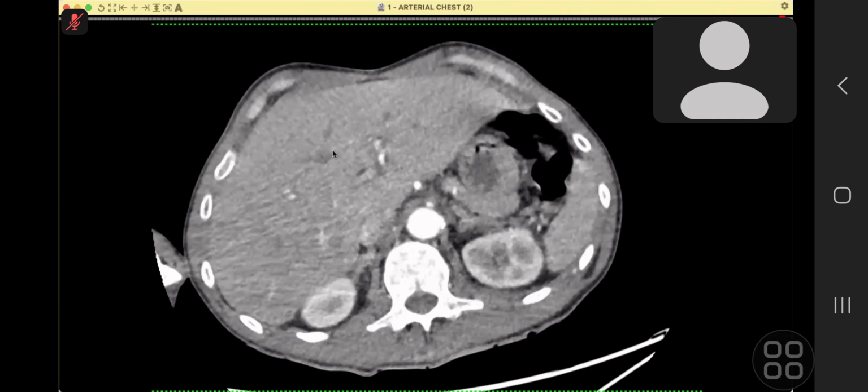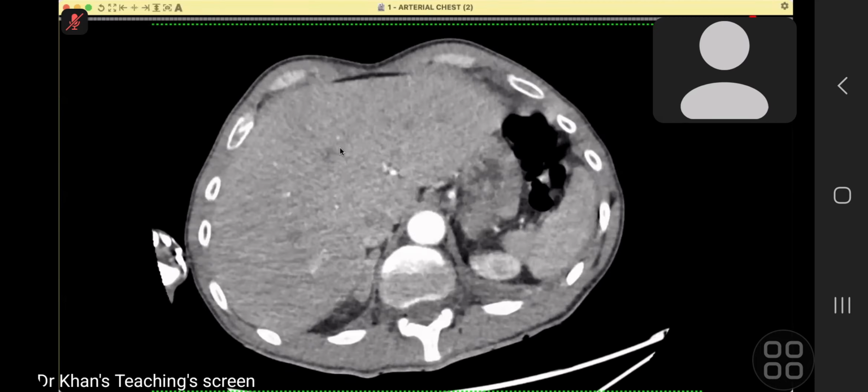Now I can scroll down. Now please describe it.